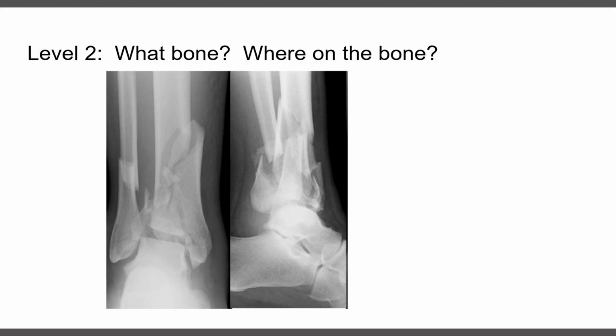Next example. If you're in fracture rounds, you're going to say this is an AP and lateral of a skeletally mature ankle. It's not the whole tib fib, it's the joint, so we call this an ankle. So running our eyes along the cortices of the fibula, definite step off here, and a step off here. So we have a distal fibula fracture.